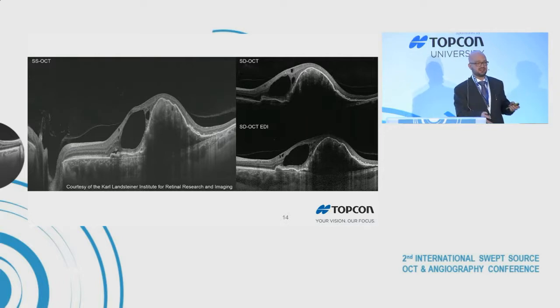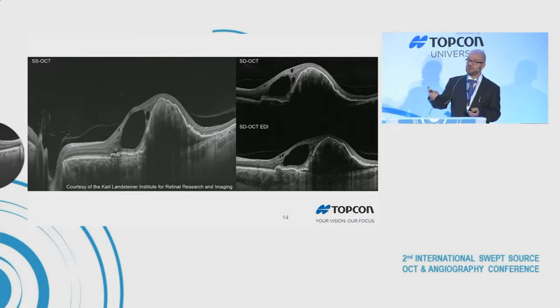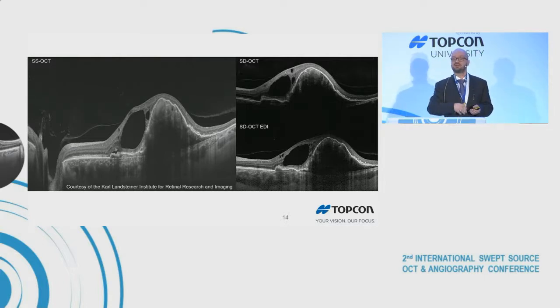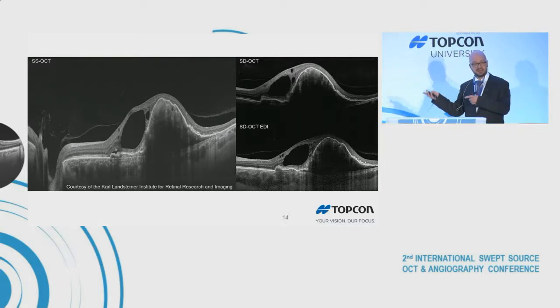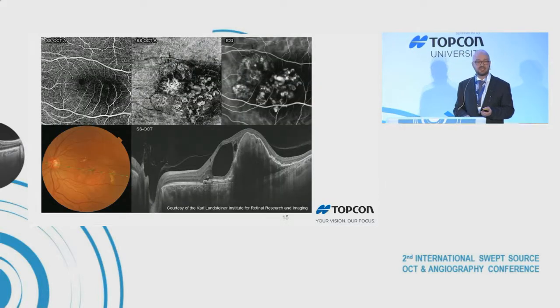Now, how is this clinically relevant? Because a lot of us have been trying to image polypoidal lesions using OCT-A, and it's proving to be a very big challenge. Now, with one of the new softwares we've put in, it's possible to manually resegment, and the segmentation self-propagates. So it's possible to segment these kind of polypoidal lesions in a different way in the OCT-A so that you can visualize them. But this means that we need to be able to penetrate through the RPE good enough in order to actually visualize it. And this is what happens then when you actually do that.